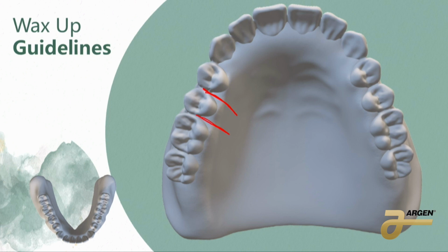Now this area here in the front and around these two teeth, that is all your speech. That's all your speech functions there. So if your patients are having trouble saying S, or they're whistling, or your practitioners are saying that their speech isn't there, that's the area that you're going to adjust. You might need to add some more, remove some more.